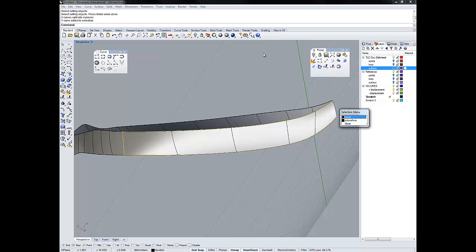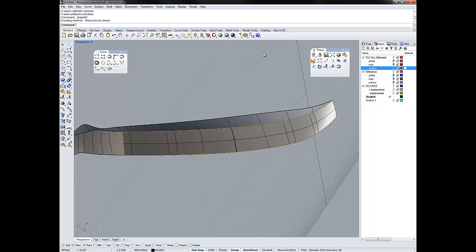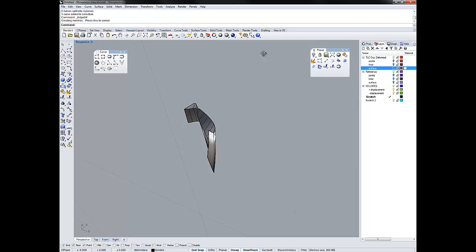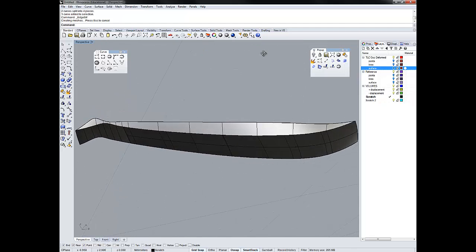and then we are going to do a surface from 2, 3, or 4 edge curves. And I click that, and that's what I come up with. All right, so this is part of what our volume is going to look like. You can notice a very slim volume.